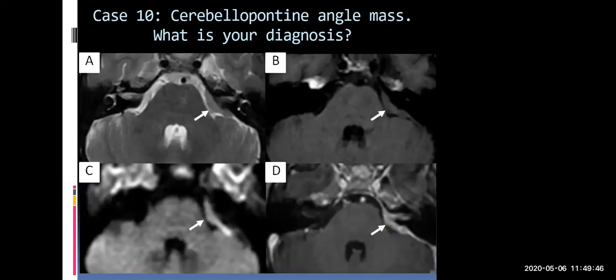So this is a very difficult one, and the only person who diagnosed this was our neuroradiologist. The rest of us thought this was a meningioma because it has this very classic appearance, slightly hypointense to the brain in certain areas, and iso and hyper. It has this sessile, en plaque, classic meningioma look. It had all these dural tails, and you can see it's iso-intense on T1. So every one of us thought this was going to be a meningioma, but our neuroradiologist looked at the diffusion weighted image and saw how bright this is.